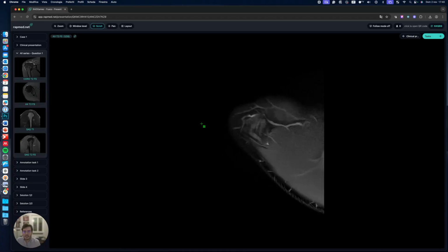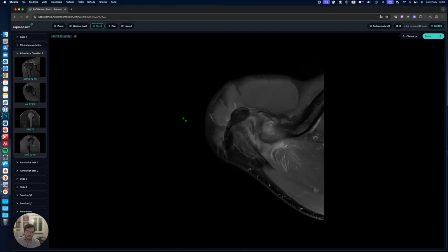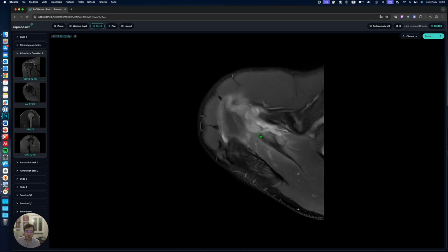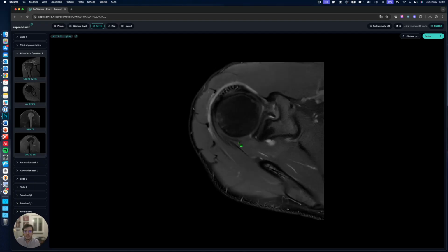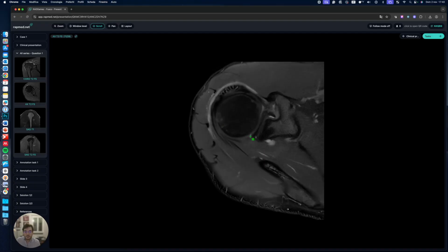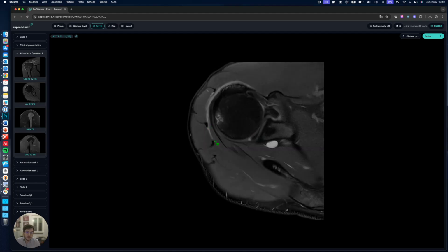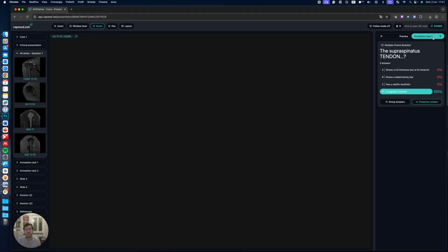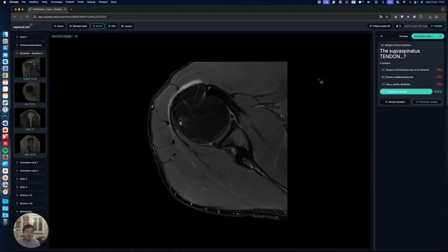On the axial, we can also find this hematoma within the fiber gap, edema within the muscle surrounding the intramuscular extension of the tendon, and lowering down we also find this paralabral cyst, probably due to a posterior superior labral tear.